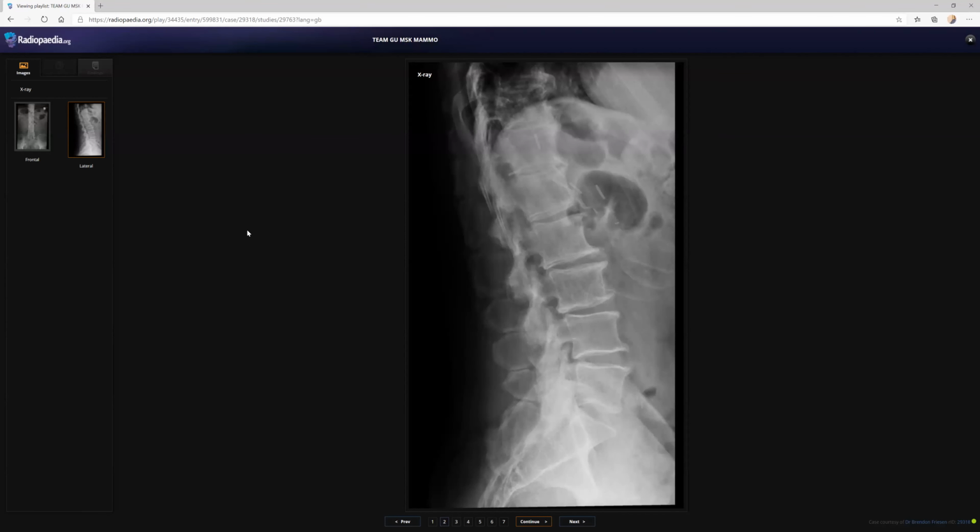So yes, I can clearly see that D11 is collapsed. It's loosened. So this is a pathological fracture involving this D11 vertebra, D10, sorry. Yes, D11 and D10. So most likely it's an osteolytic lesion secondary to the renal cell carcinoma involving the left kidney. Since the patient is a known case of renal cell carcinoma with left nephrectomy, if there is no previous film showing these findings, it's a new finding. It has to be urgently conveyed to the urology or oncology team with further MDT, further evaluation with a bone scan, then CT chest, abdomen, and pelvis for further evaluation of metastasis.